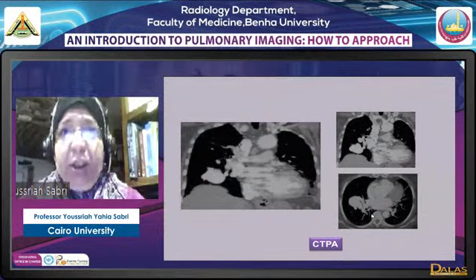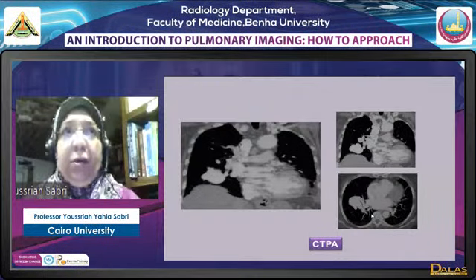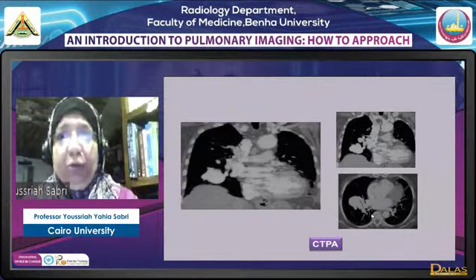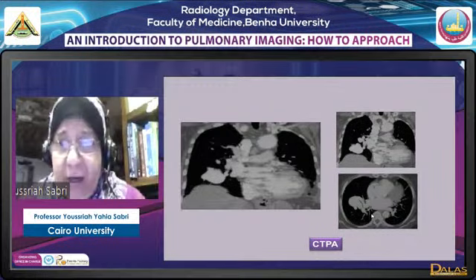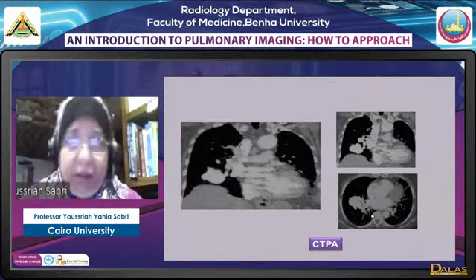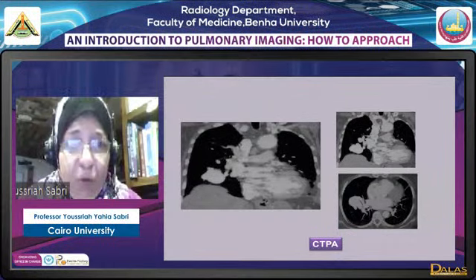We do a CT pulmonary angio here. We diagnosed the case as AVM, but we don't diagnose for the fun of it. We diagnose the patient to treat. To treat, we need to know the number of vessels supplying. Where are these vessels coming from? How many are there? How many draining veins, and where do they go? So we must do a CT pulmonary angio in spite of the fact that we know it's an AVM.